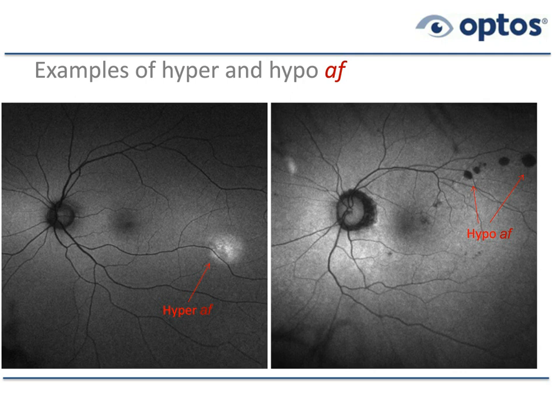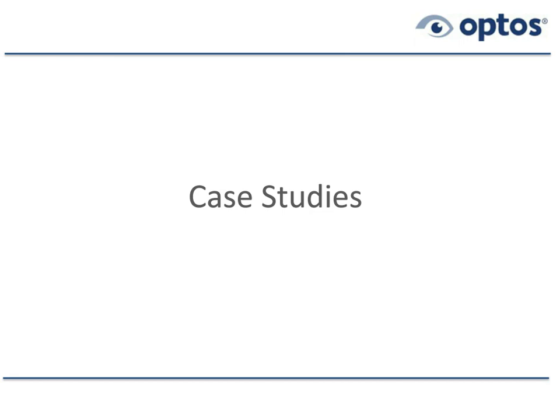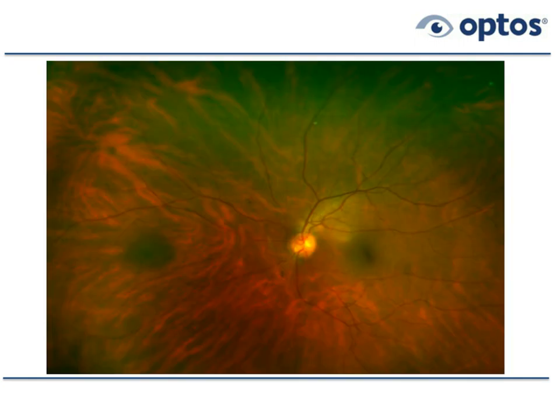Let's talk about some case studies. We'll begin with something easy, and as a general rule, we're going to give you the diagnosis before we actually go into the detail. So the first condition is a choroidal nevus, which by definition is something that exists at the level of the choroid. This is an ultra-wide field color image, and we can see this lesion in this left eye, nasal to the disc, and it looks like a darkly pigmented lesion. It occurs in about 10% of all patients who get this procedure, ultra-wide field imaging, and it probably is at the level of the choroid.